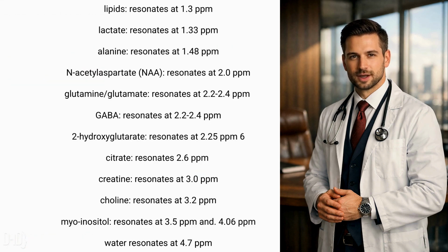Normal peaks of metabolites. Lipids resonate at 1.3 ppm. Lactate resonates at 1.33 ppm. Alanine resonates at 1.48 ppm. N-acetylaspartate, NAA, resonates at 2.0 ppm. Glutamine and glutamate resonate at 2.2 to 2.4 ppm. GABA resonates at 2.2 to 2.4 ppm.